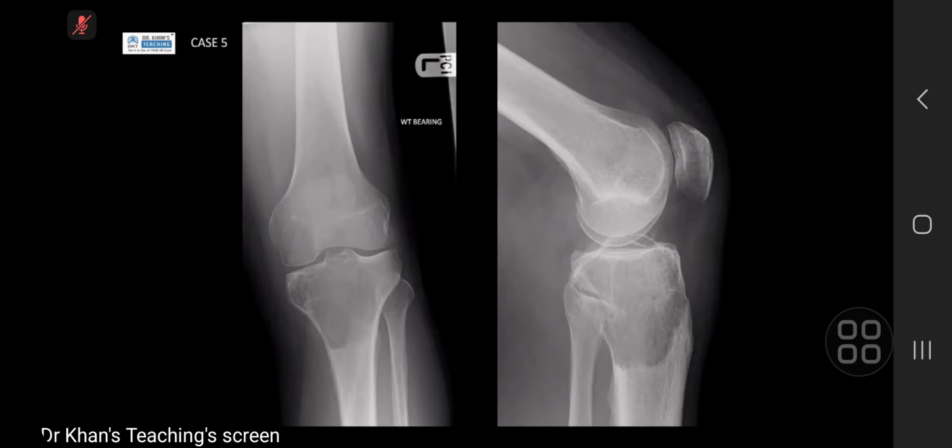What in particular are the features that you're citing for it being an aggressive lesion? Aggressive bony lesion, usually I have a wide zone of transition. I usually have periosteal reaction, marked periosteal reaction. I see if there is soft tissue mass or swelling, considered for the pathology.